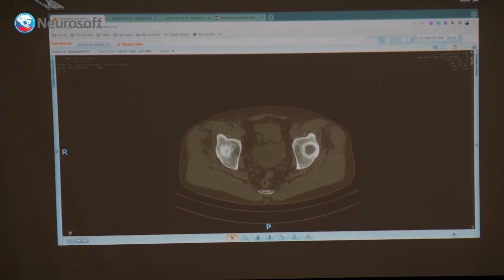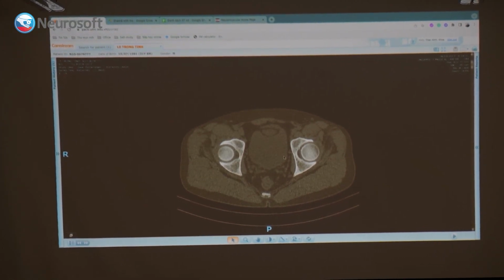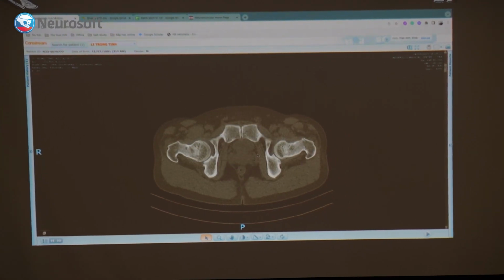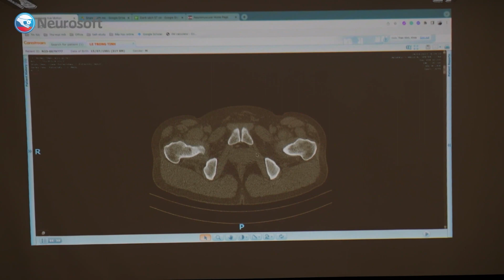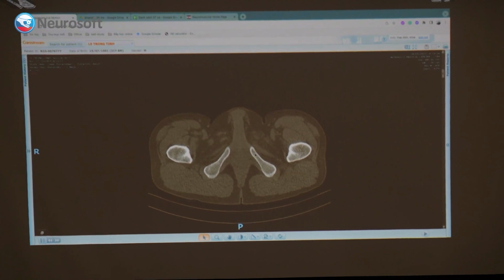We don't have MRI this case. Yeah, it's okay. They do CT. Adductor minimus is also affected, right? In Japan, they do more CT. Gluteus maximus is very well preserved. Cơ mông lớn của bệnh nhân này thì rất là tốt. Cái này là CT cơ.